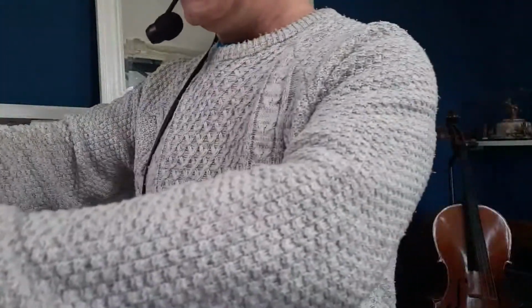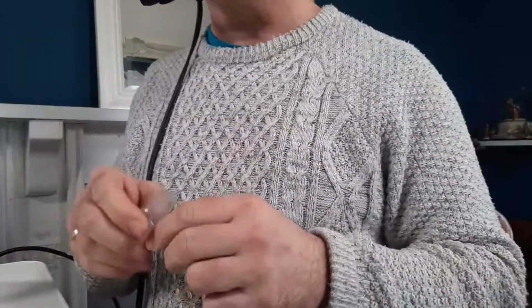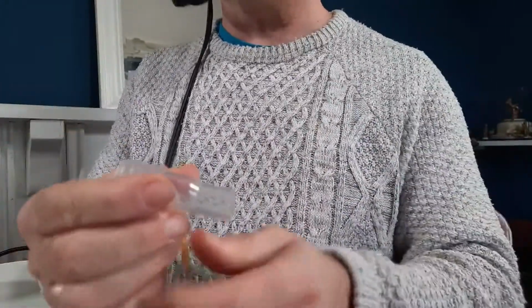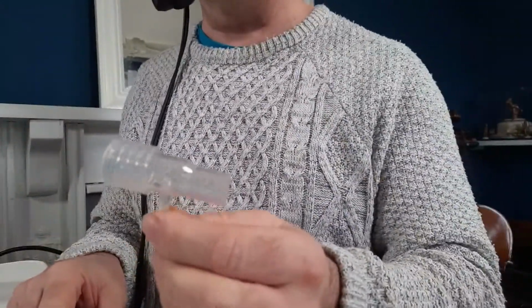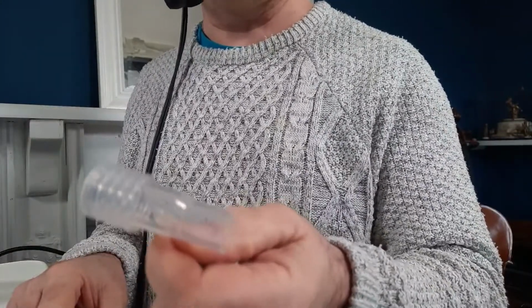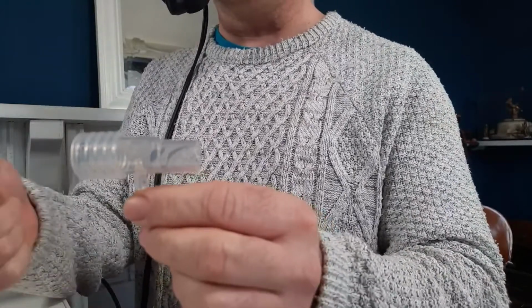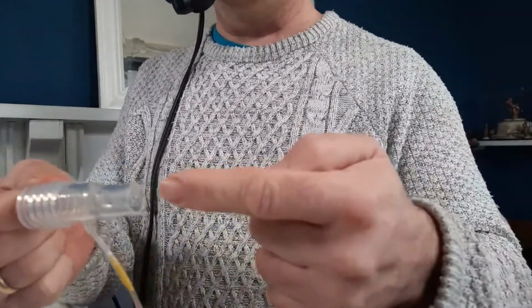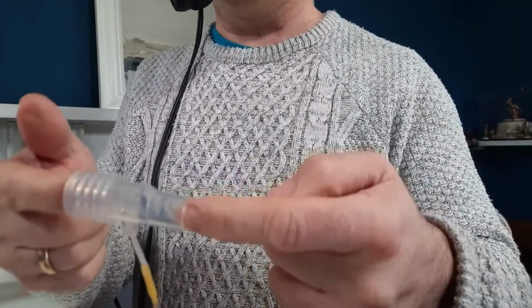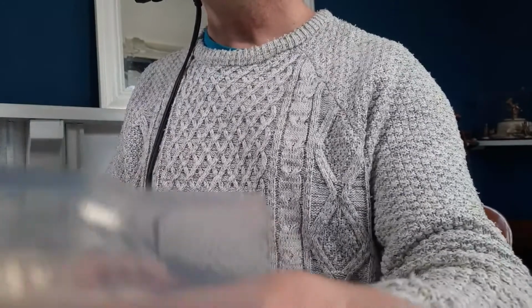The other thing that we're going to need, and I've jumped a few steps, I've just realised, the one thing that's really important is we're going to need one of these. For us, this is an end-tidal CO2 monitor thing, gadget, I'm not sure what you call it, but this goes in line. So this is, you've got your ventilator, and eventually your tube will be on opposite ends, and you could possibly see, if I can get it to focus.